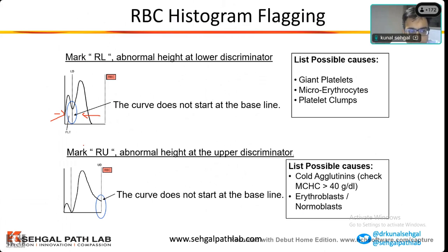I'll show you the cases. What I'm trying to explain to you is that the names of the flags are individual to your particular machine and model. Please understand it. They are just telling you, please look at the histogram. And we keep avoiding that.